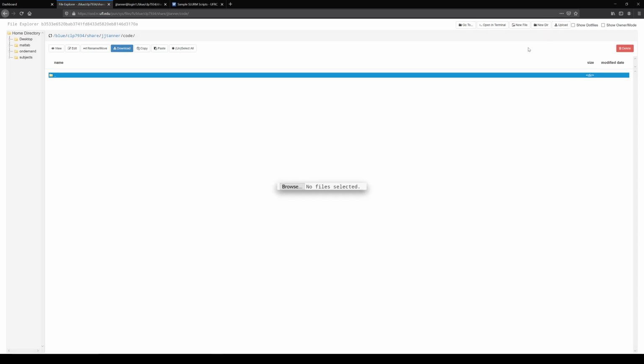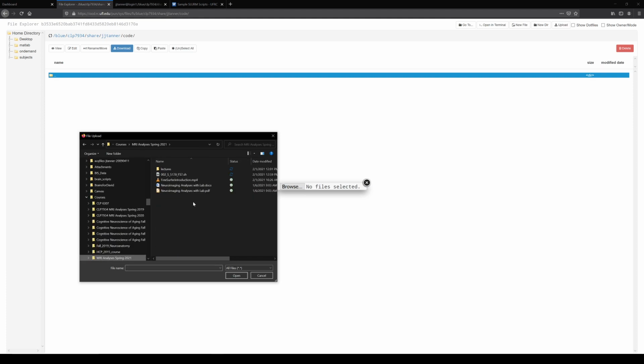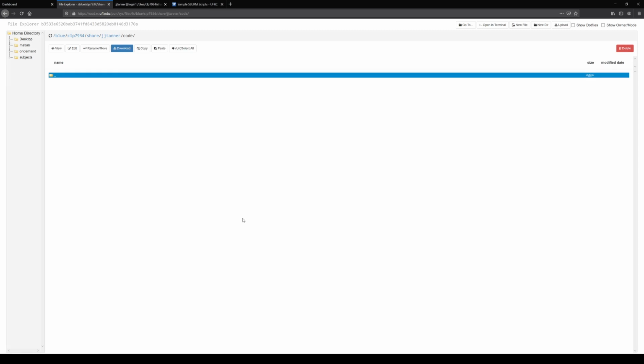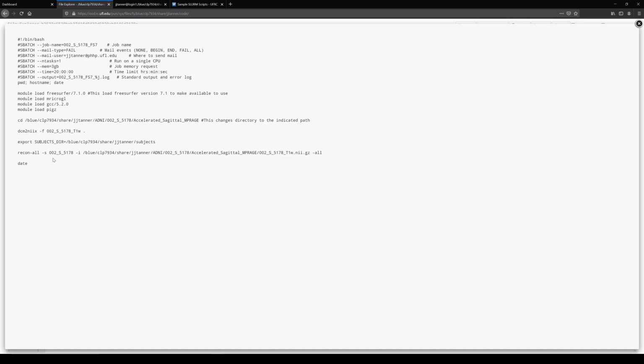But let's upload. I'm going to browse, and I need to go to my class directory, and here's the file name. So it's uploaded. It's very small, and so a very fast upload. So I can just view it just to verify that it's there.